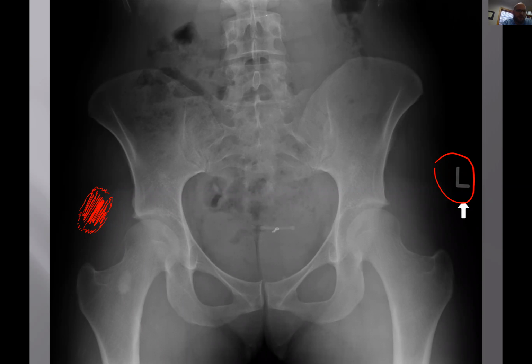Anybody want to throw down the diagnosis for me now? Well, a bone island or a non-ossifying fibroma or a fibrocortical defect would be your three, I would think. Right. And of course, this is not around the cortex. They're a little older. So that's a young person. NOFs are usually going to be bigger than this, but that's a good thought. These are all this. So yeah, this is a bone island.